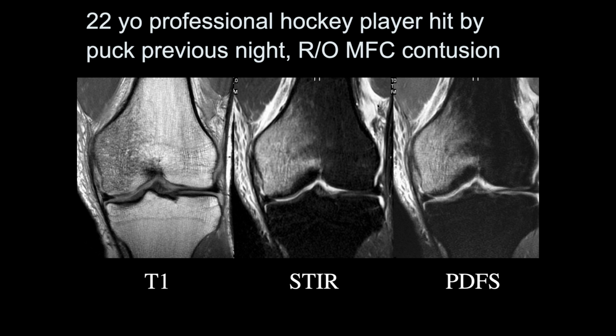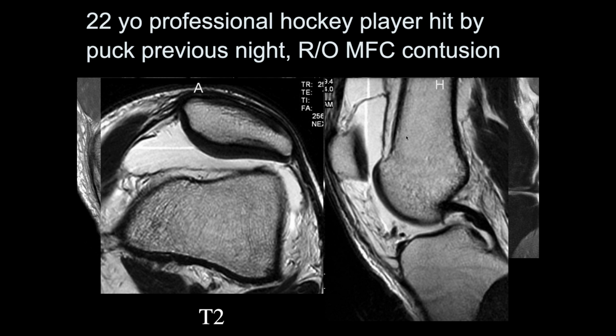22-year-old professional hockey player hit by puck the previous night. Rule out medial femoral condyle contusion, which I don't believe we will. There's quite a bit of edema just throughout the entire medial femoral condyle. There's also a lot of soft tissue edema overlying. The MCL looked intact, but it might have a little bit of signal as well. PCL looks intact, large joint effusion.